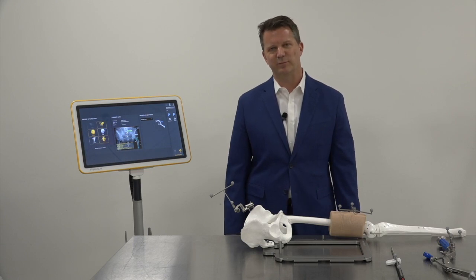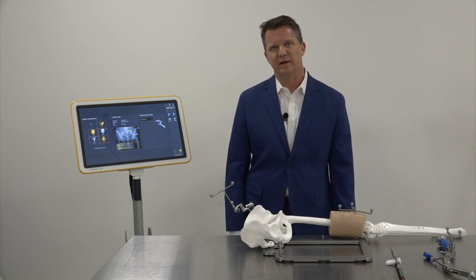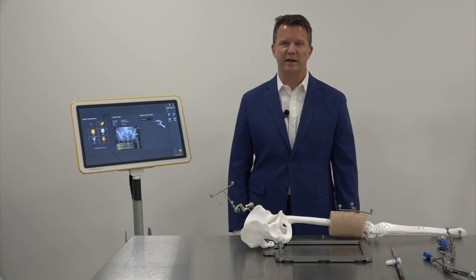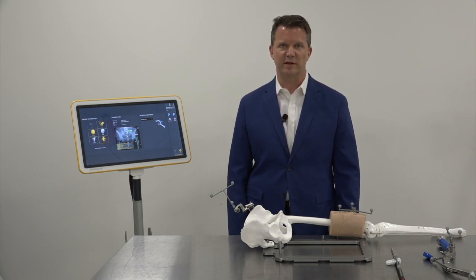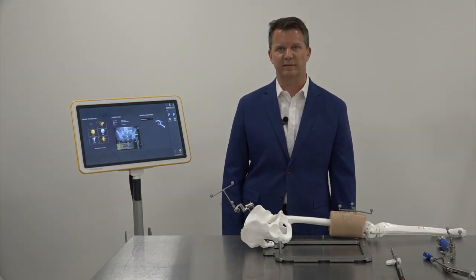With increasing patient expectations, it becomes increasingly important to deliver individualized component position in total hip arthroplasty. HIP7, a software-guided surgery system offered by Smith & Nephew, enables the surgeon to digitally measure cup anteversion and inclination, leg length and offset, and also assess patient-specific pelvic tilt, and also provide a simulated post-op AP X-ray to give the surgeon qualitative information about what the post-op AP film will look like.